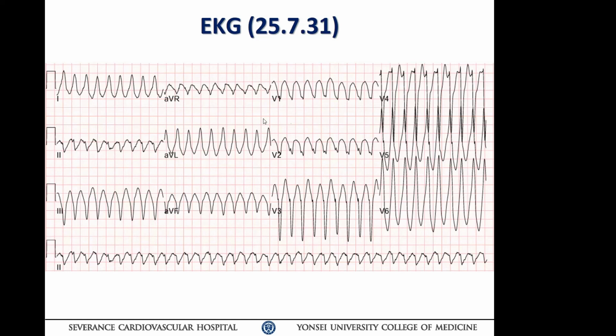Yeah, I agree with Dr. Chong. Even though this patient has a circumflex coronary lesion, I'm not sure that the coronary ischemia affects this VT. It could be affecting the maintenance mechanism, but the focus is away from the coronary lesion area. But this VT happens a few days after the surgery. Am I right?